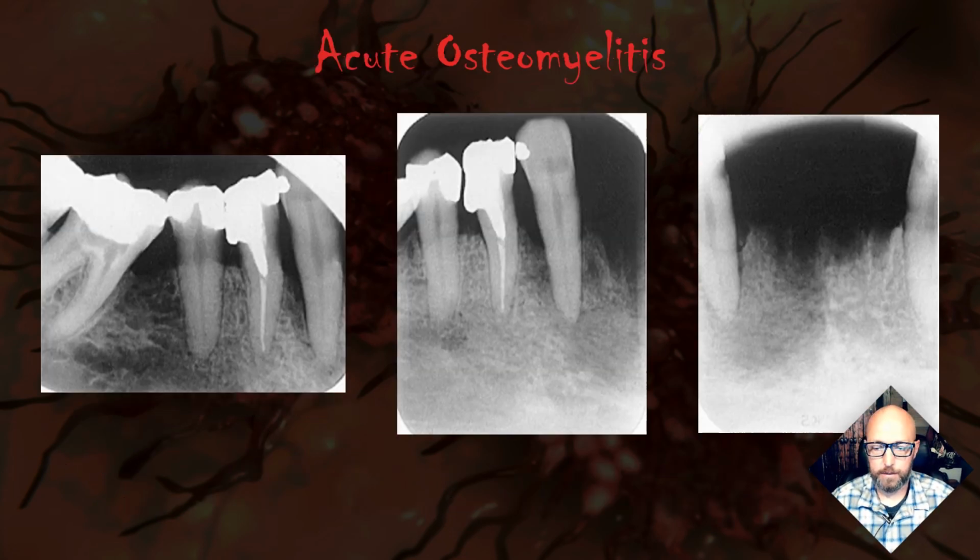All right, as promised, acute osteomyelitis here. So what do we see that distinguishes this? What do you see in general? We see some radiolucencies, right? Are these well-defined like some of those other cysts and benign tumors that we've noted? No, this is kind of the definition of ill-defined, where it has a blending border, where you're not really sure where the border started, where the lesion started and where it ends. In some of these areas, this looks like a well-defined lesion, but these are the ones we're talking about where it has a blended border.